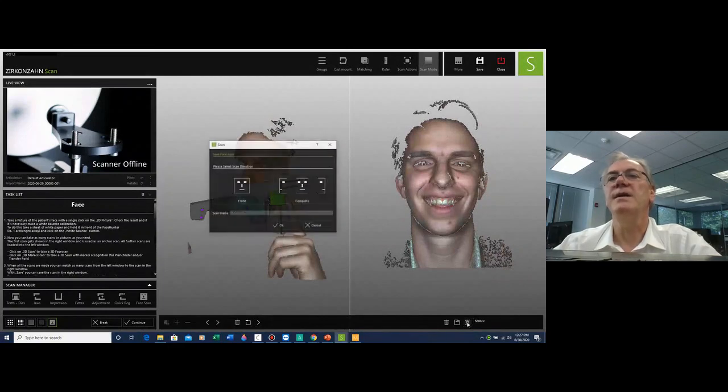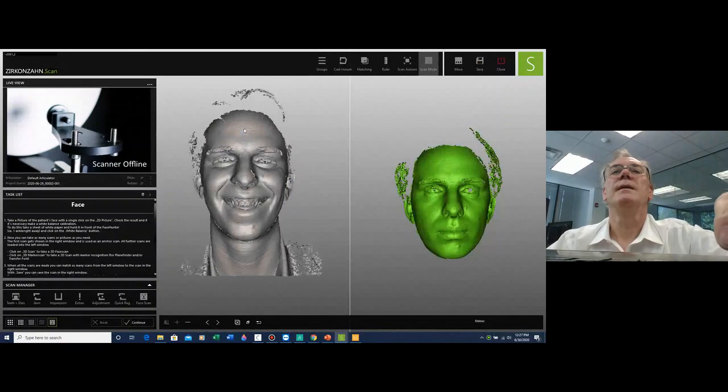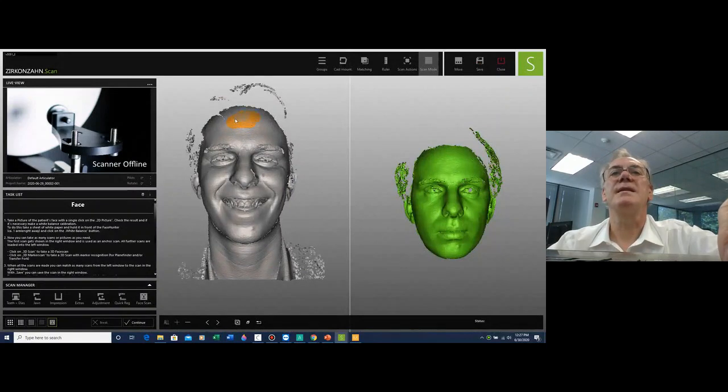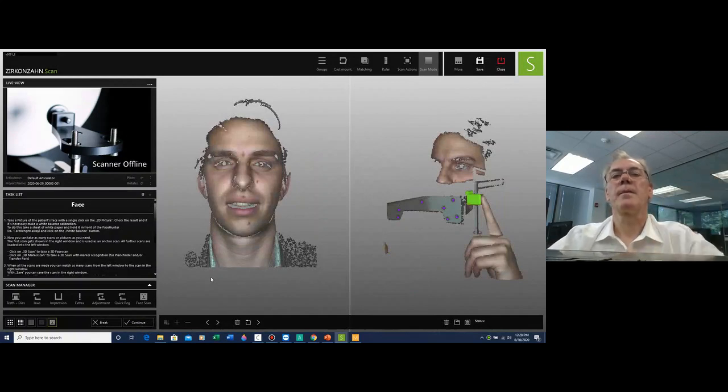We will save this. What is it? It's the front smile. Computer names it, and we say OK, and now we are going to match it. I'm not going to consider this as an actual functional image that I use for the mount in the articulator. This is just a reference that I'm going to use in relation to the midline and confirm that our case has been mounted correctly.